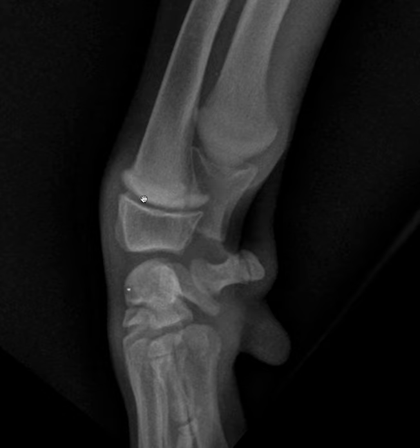When I'm looking for a defect, we know that the cartilage should become ossified as it comes into the metaphysis. So that's part of that zone of ossification. If you see lucency in the metaphysis, you should become concerned about the possibility that the ossification process has been disrupted by a pathology. In this case, you can see that the opacity is actually quite uniform and looks quite good.